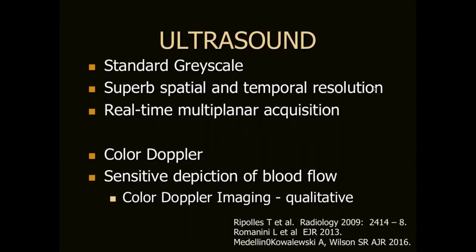So when we look at ultrasound, this has been very nicely described by the two prior speakers, we have standard grayscale evaluation that allows us to see, without any additional contrast agent requirement, all of the layers of the bowel wall. So ultrasound affords superb spatial and temporal resolution. And of course, the real-time multiplanar acquisition of imaging of the bowel is really requisite, and it just allows us a really exquisite visualization of the bowel wall.